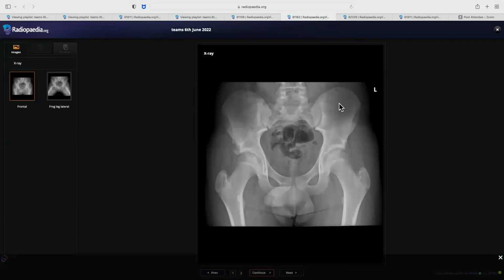Come back to this. So that's the next case. Okay, this is a radiograph of the pelvis, and I can see that there is an avulsion fracture within the right anterior inferior iliac spine. So I will inform the clinician about this finding, and the patient should be on conservative management, away from exercise till recovery. Which muscle attaches there? Okay.